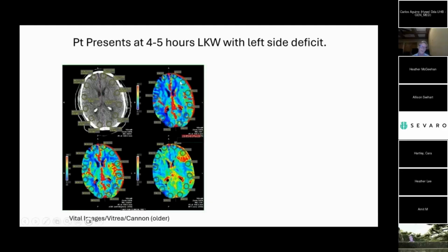Now let's look at CBV. In this case, the normal side of the brain is this blue, darker blue, lighter blue, and this over here, the green, is actually elevated. So we have the stroke here, the prolonged MTT, and the CBV is also elevated. That is penumbra. Same with this. Prolonged MTT, increased CBV, this is penumbra. So if we can restore blood flow.